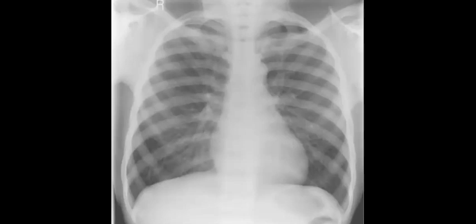Okay. There is also one rare. Maybe you can mention it at the end of your list. Something called myelofibrosis. Then you will go to look in the spleen again, and you expect that you will find splenomegaly or autosplenectomy as in sickle cell. You will find splenomegaly, yes.